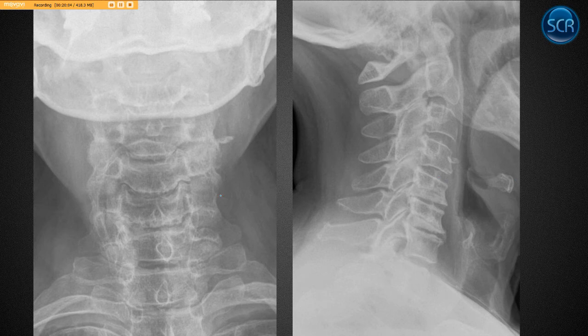All right, what is this one showing? This one's showing some degenerative uncinate arthrosis here. We've got uncinate hypertrophy. That shows up as pseudofractures in the lateral view, so you don't want to mistakenly call these fractures. That's just because the uncinate process is hypertrophying up here, bringing that joint into view on the lateral projection. Same thing down here. So these are not fractures; they're pseudofractures simply due to uncinate arthrosis, and they also have little carotid artery atherosclerosis.